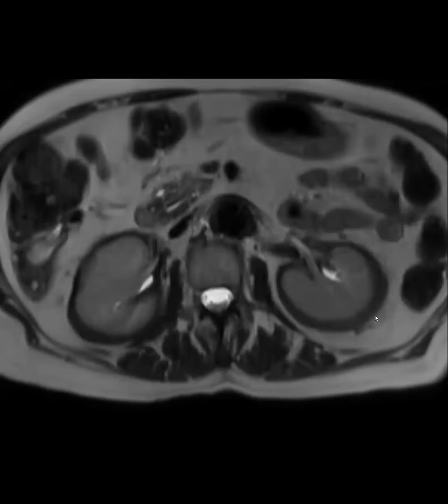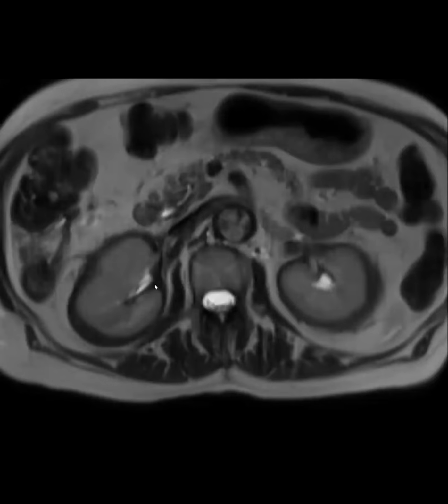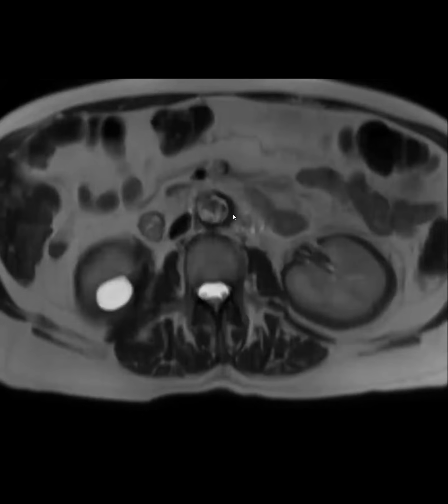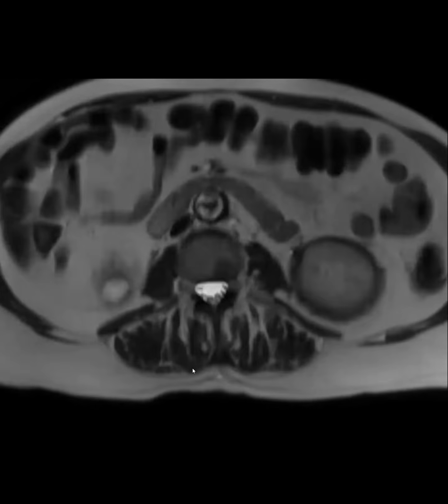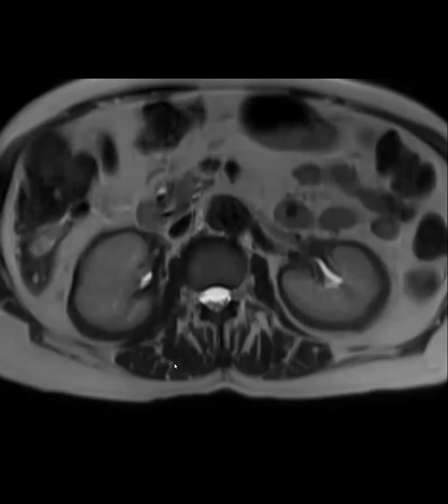And so this patient has known multi-system IgG4 disease. Oh my gosh. They have been treated with steroids and then actually multiple rounds of rituximab, I think. And this is basically chronic fibrotic retroperitoneal fibrosis, perinephric, periadrenal, and periaortic. Wait, I'm sorry. Orbital swelling is a feature of IgG4? Yeah. It likes to go to parotids, orbital glands, lacrimal glands, salivary glands.